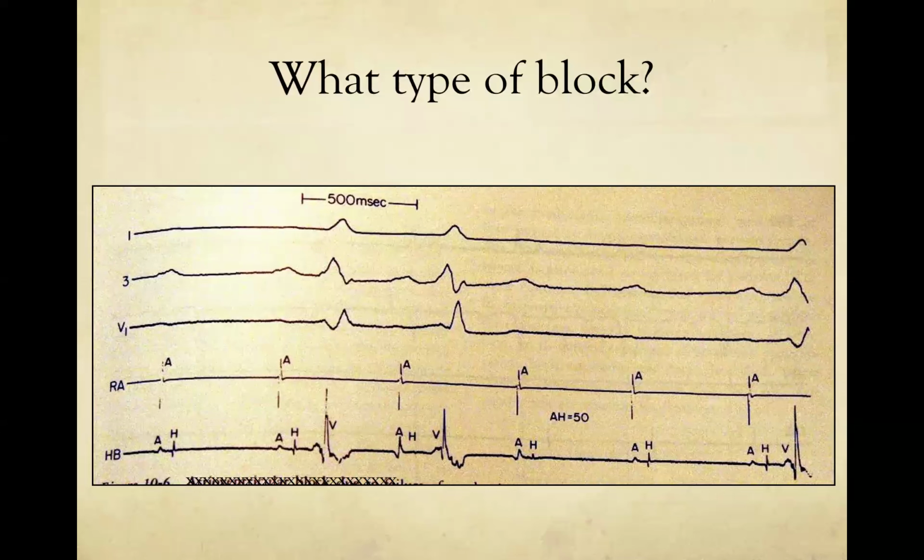For Dr. Paz, I'm looking at the His bundle electrogram. For the first one, I see an AH. I don't see a V. For the next two, I see an AHV. And then the couple after that, I see AH and not a V.